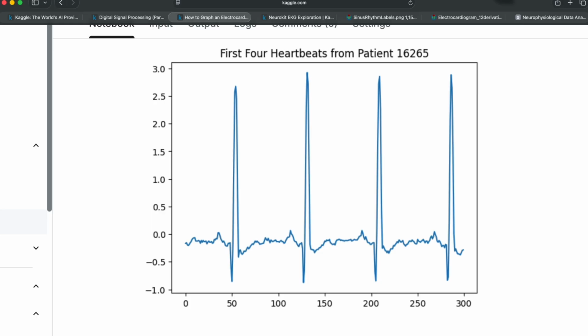on EKGs in particular. This tutorial assumes that you're pretty new to Python. Maybe some terms or things will be kind of new to you, but we'll try to explain as we go along so that you can still get the gist of how you can do this yourself. We'll also have code that you can copy yourself and play around with after so that you can continue learning.